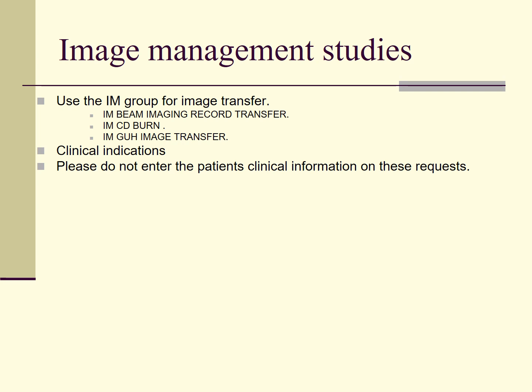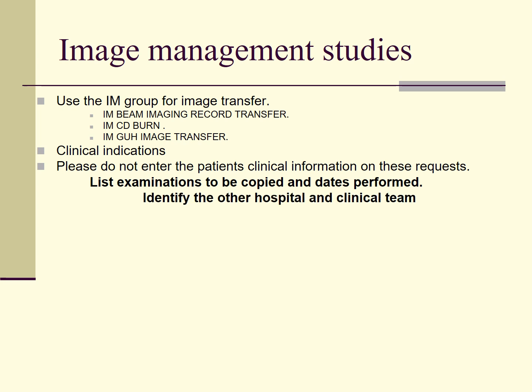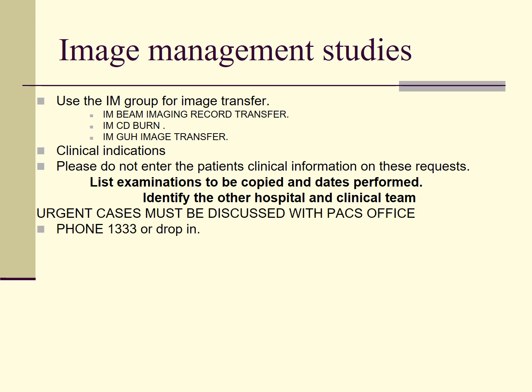Use the IM group for image transfers. IM BEAM image record transfer, IM CD burn, IM GUH image transfer. In the clinical indications section, please do not enter the patient's clinical information on these requests. Just list the examinations to be copied and dates performed. Identify the other hospital and the clinical team.